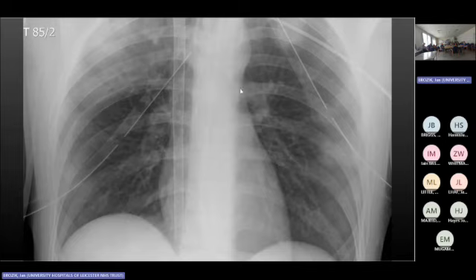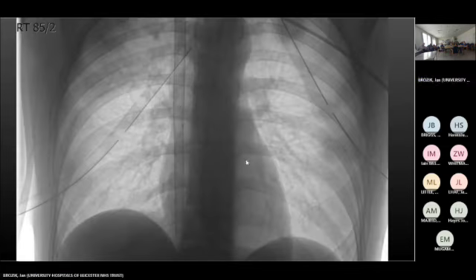We knew that this was someone who was a recreational drug user. So if you say they're taking drugs, they could be HIV positive, and we have ground glass opacities in upper zones. This PJP usually happens at radiology conferences. Yeah, those who can distinguish it, they usually get an award because they nailed it. Yeah, so with it, well, this is inverted.